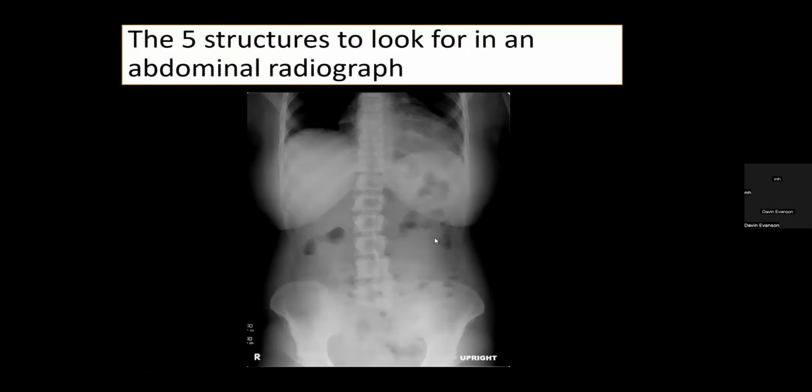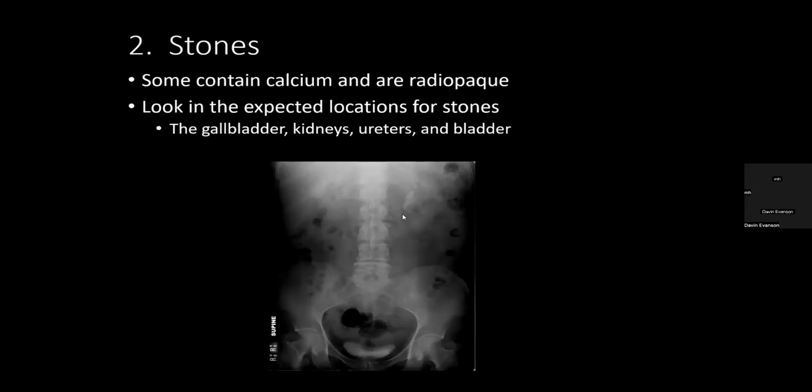Okay. So let's go over some key concepts, how to read an abdominal radiograph. I'll repeat this with the Hartman pearls, but I like this version. It's important to know how the film was taken, upright or supine, and our mnemonic is going to be stones, bones, mass, and gas. We're usually doing this because the patient has pain and we're looking for the source of the pain. And we always start with lines and tubes. Whatever you do in chest x-ray, KUB, CT, always look at lines and tubes. That sort of goes under stones. Anything radiopaque, we have to explain, but always start with the lines and tubes first.